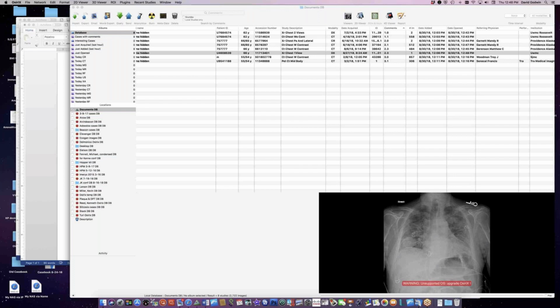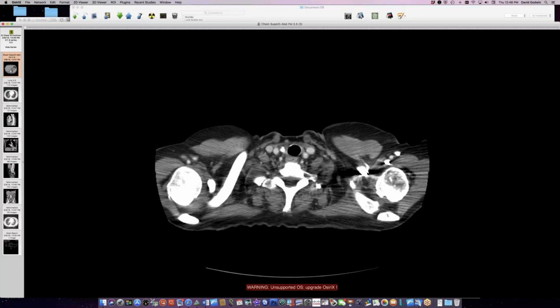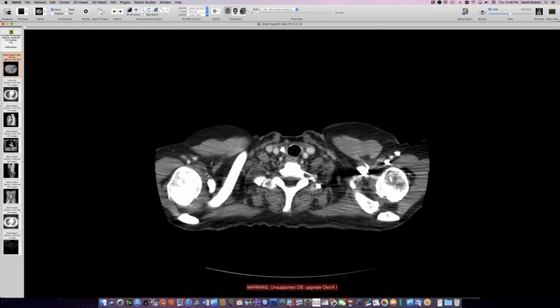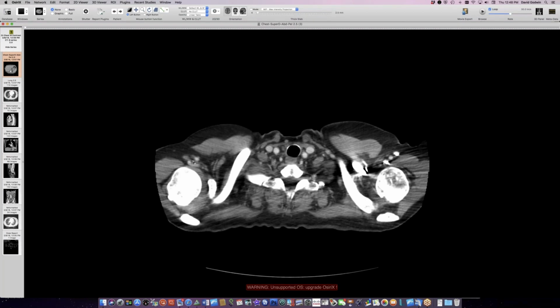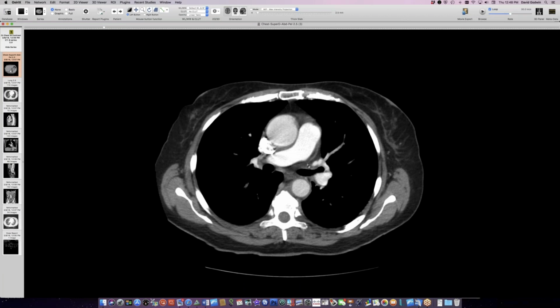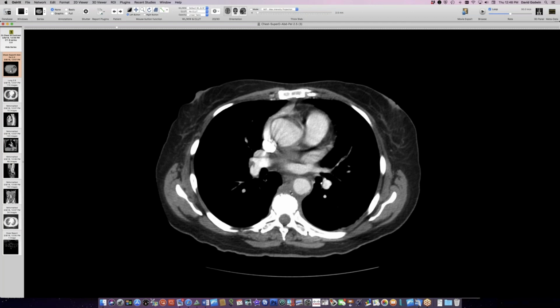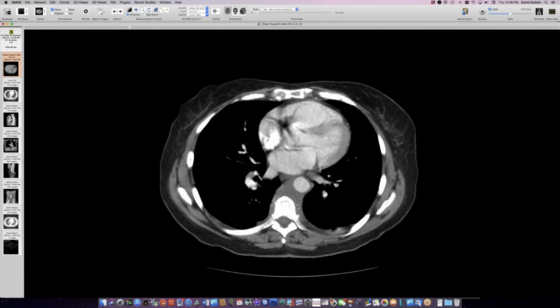Wow. And here's what the current radiograph looks like. Instead of having the patches, now we have diffuse lung disease, low lung volume, and here's that cavitary thing that had the nice fluid level on the CT scan. Now this person has some mediastinal abnormality here, some tissue that does not belong, sort of soft-looking tissue. We've got a lot of stuff here in the posterior mediastinum near the aorta, thickening the tissue there and discoloring the fat.